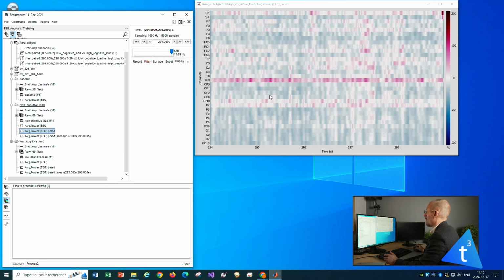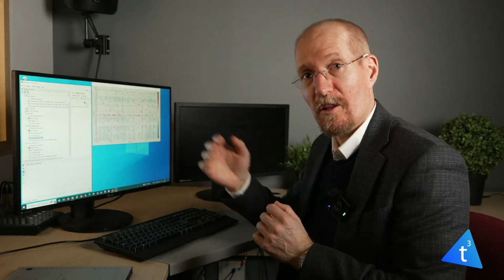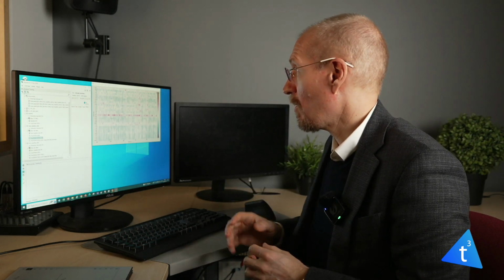This can be useful to identify problematic channels, or in cases where we have specific event onsets that you might be interested in targeting, where the timing was not perfect enough to use an ERP-based approach, and you use an envelope extraction like a Hilbert transform here. We can still identify those events of interest using a visualization approach like this.